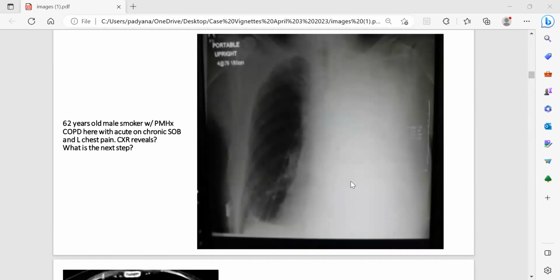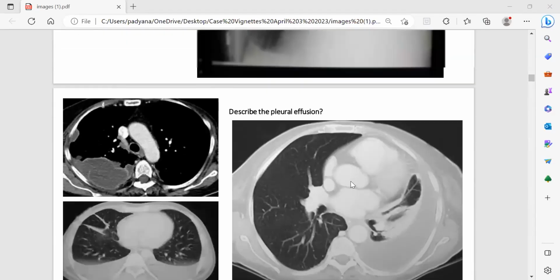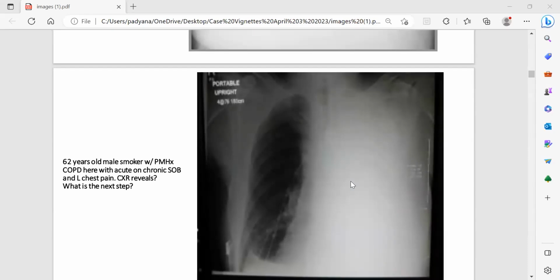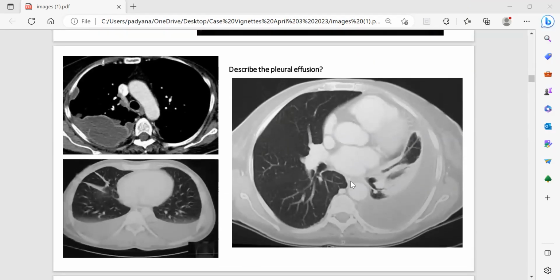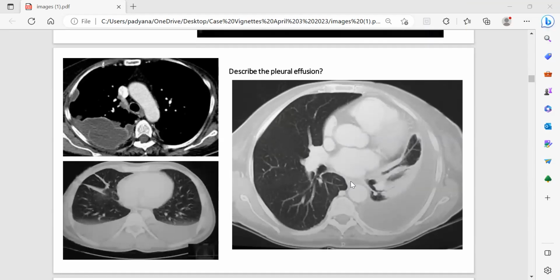Okay. Yes, I think we are fed up of this X-ray. I think I'll change. Again, yes, you are expected to see one-third of the heart here. So it's not really one-third. So naturally, it's a total collapse on the left side. Yes. Ajith is more interested in answering the questions. He's keen to take ICCM again.